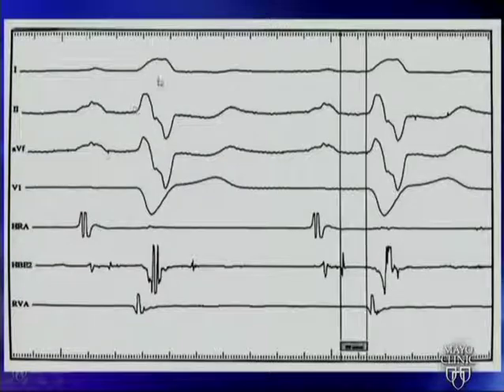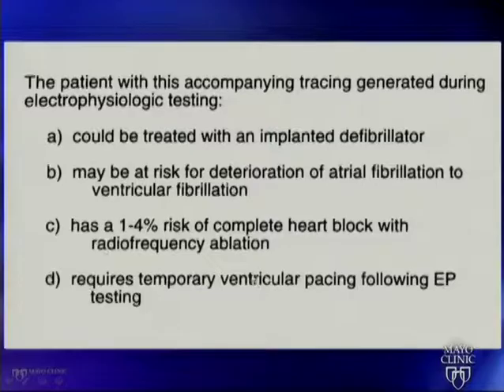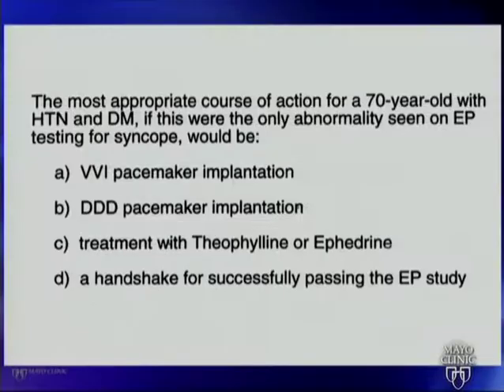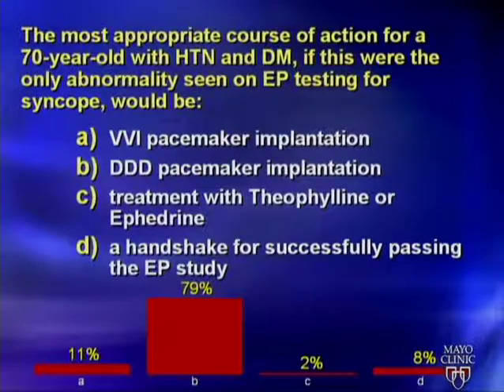So P wave, QRS, A, His, and then V. So choices. Okay. I would agree with that.